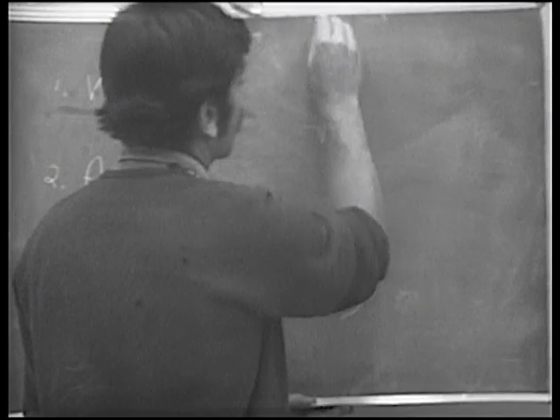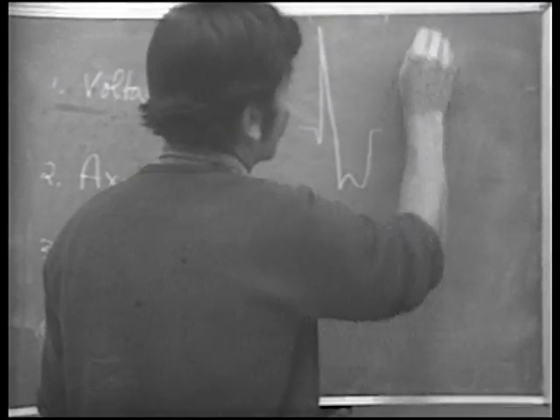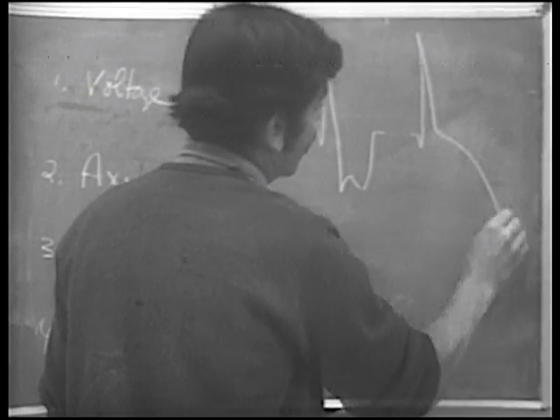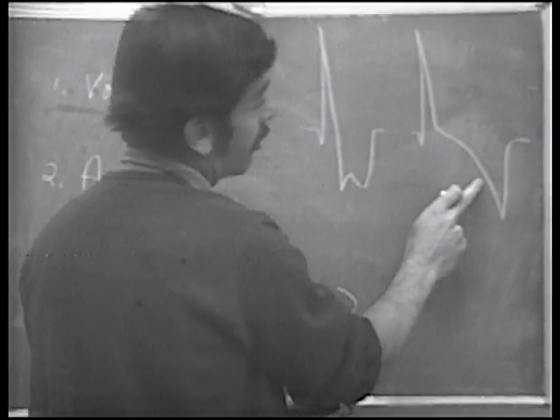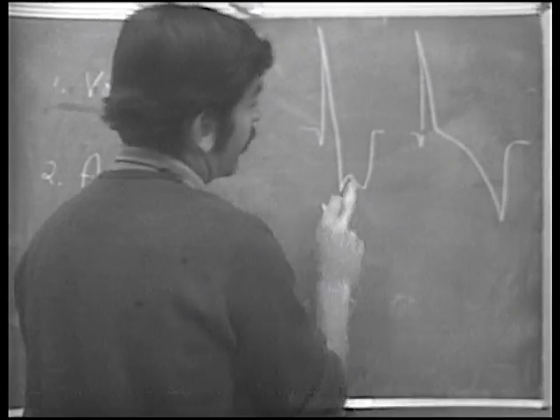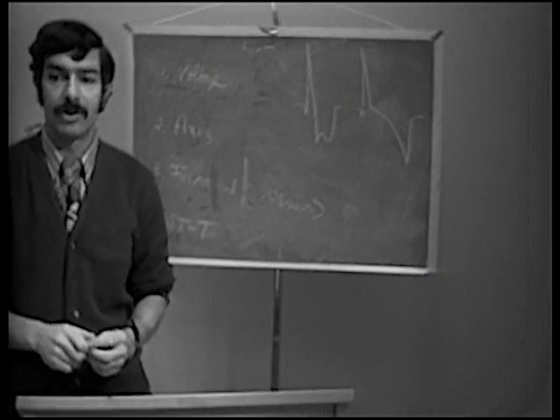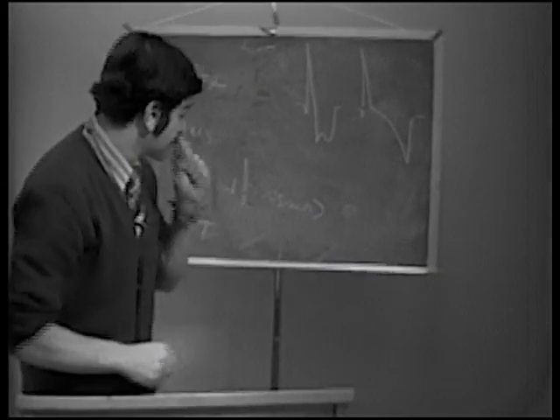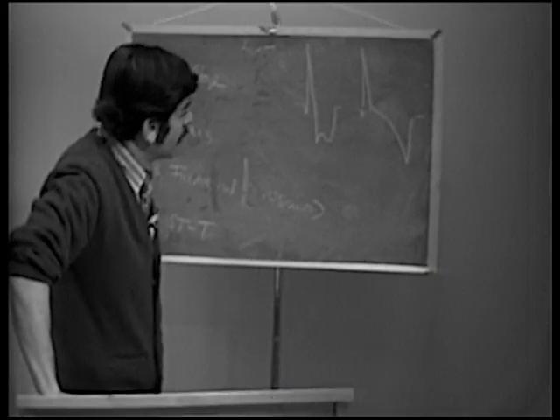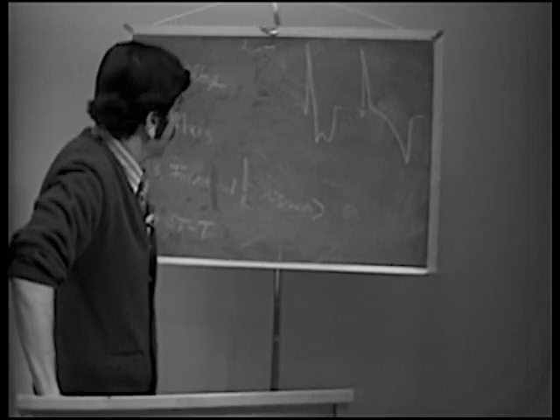And they look like this. It might look like this, or they might look like that, which is another common appearance. This is the asymmetrical T wave, down slow, up fast, and this is just ST segment depression, which looks like ischemia, as we've previously described it. Okay, so these are the types of ST-T wave changes.